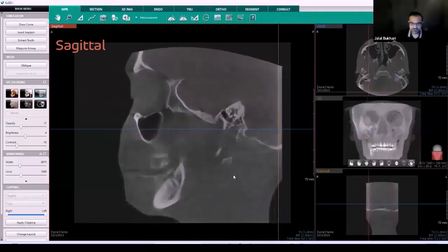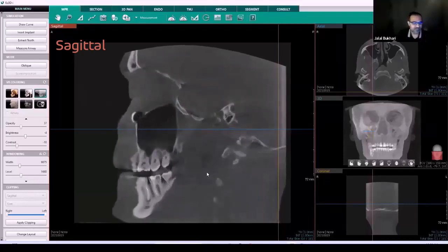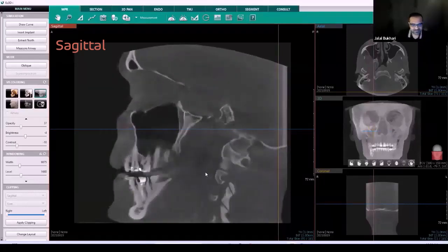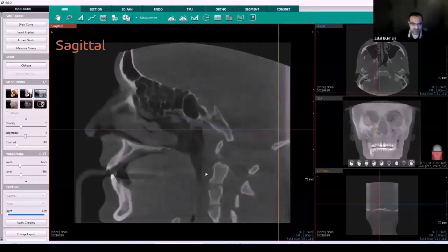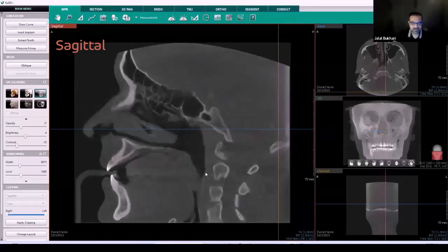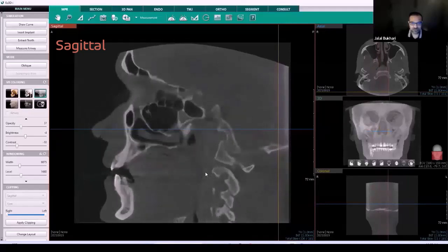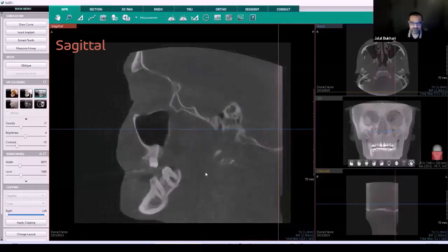Another very common calcification that we can see is called a stylohyoid ligament calcification, which can be seen around this area just posterior to the mandibular rami. Again, it's something incidental, but really great information if the patient does have specific signs and symptoms. And we are scrolling all the way towards the left side to make sure that we went through it once.